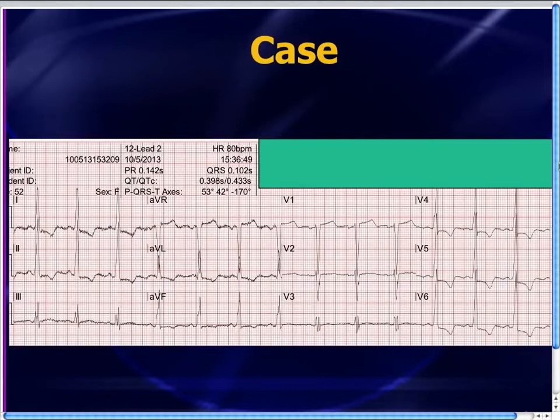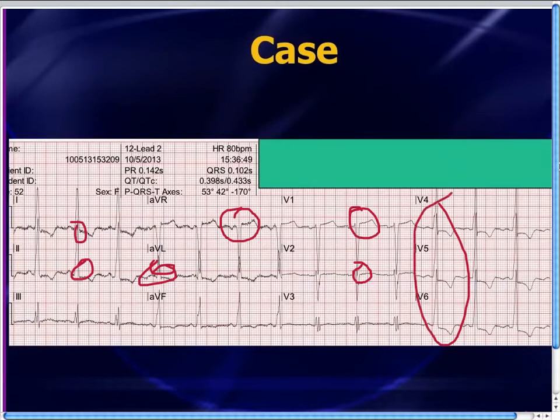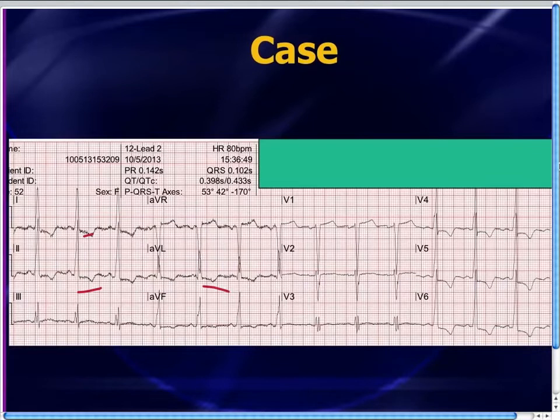Take a look. There's ST segment elevation in some of the leads, maybe a little bit of ST segment elevation there as well, and AVR, ST segment elevation there. That's concerning. We've talked about that before. There's ST segment depression in 2 and in I missed that. AVL lead 1 and maybe some ST segment depression out there. There's also T-wave inversions in a bunch of leads. There's a whole heck of a lot of abnormalities here that ought to be making us think of cardiac ischemia and maybe activating the cath lab, right?